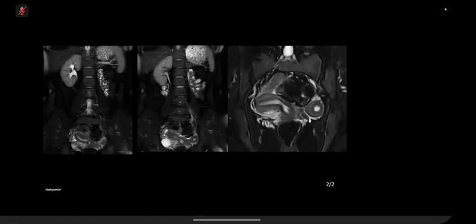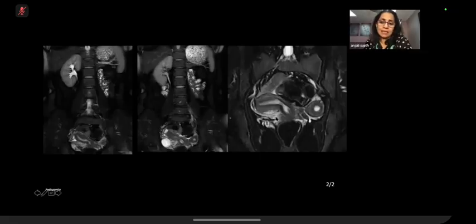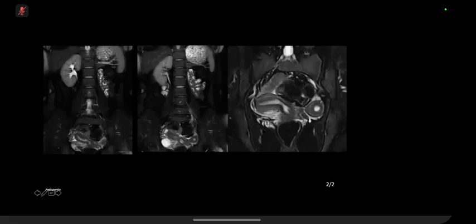I can't see the cervix on this. Can you see if the two uterine cavities are communicating with each other? I can't see that they are on the images that I've got. They seem quite separate. Although on the second image, they could be coming down lower to communicate, it doesn't appear on the views that I've got. I don't think they are.